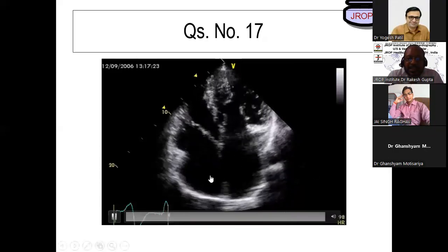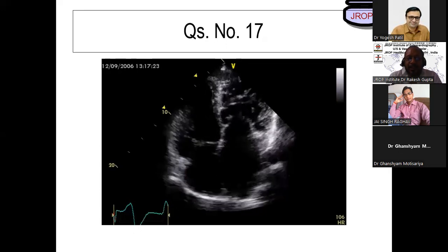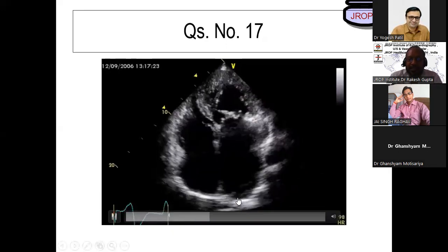Look, this is LA, this is RA, this is mitral valve. You said this is not mitral valve, this is apically placed. This is tricuspid valve. Yes, sir. Basally placed mitral valve. So RA is attached to LV. It's a clean shaven structure, LV. This is heavily trabeculated, so this is RV. So LA is attached through tricuspid valve to RV. This is a classical example of atrioventricular discordance. And why do you say this is LA? Pulmonic veins are classically seen over here. Okay. Good job done.